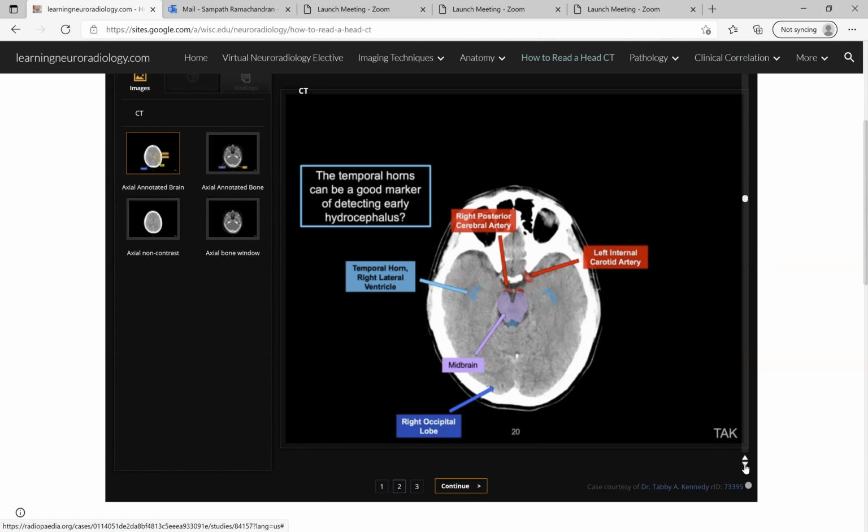Okay, this is important here. Coming into the midbrain, this portion here we call the crus cerebri, an important structure that you can find. It sits above the pons, and this is called the interpeduncular fossa.